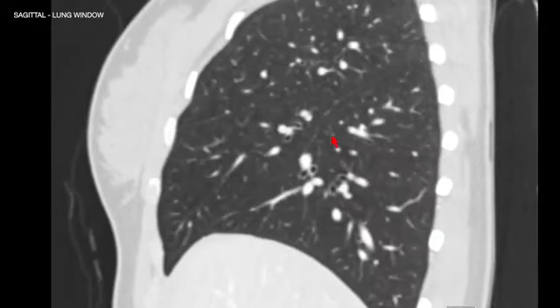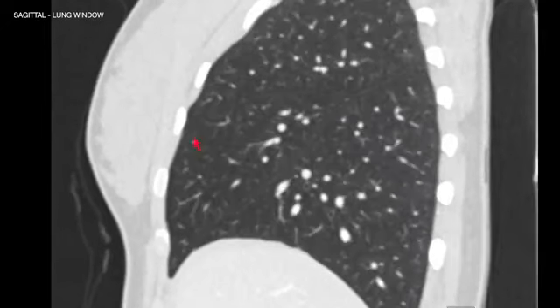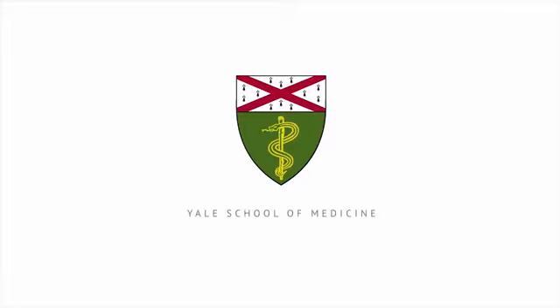The right lung has three lobes: right upper lobe, right middle lobe, and right lower lobe. The right lower lobe is divided from the other two by the major fissure, and the upper and middle lobes are divided by the right minor fissure. We can see the costophrenic angles are sharp and clear, and that's where fluid accumulates in case of pleural effusion.